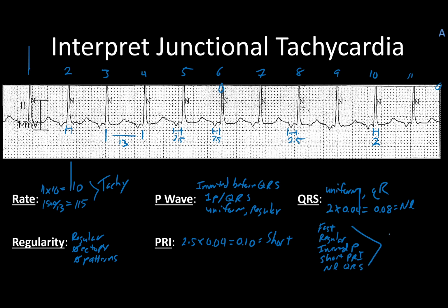That is junctional tach. Just like that.